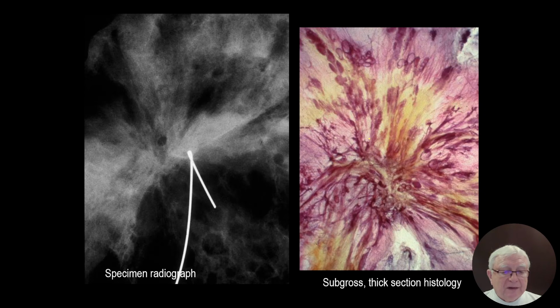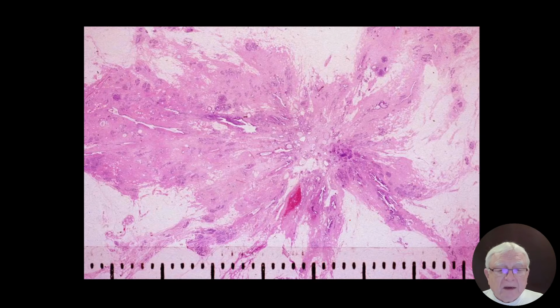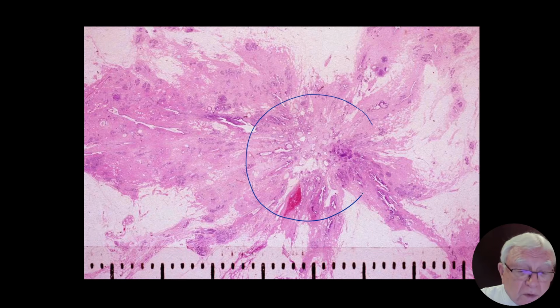Here it is. Isn't it beautiful? Enjoy the proliferating ducts. Pretty skinny, no cell proliferation, nothing. But the lesson is here again. If the surgeon was cutting just this one, then you would miss these cell proliferations at the periphery.